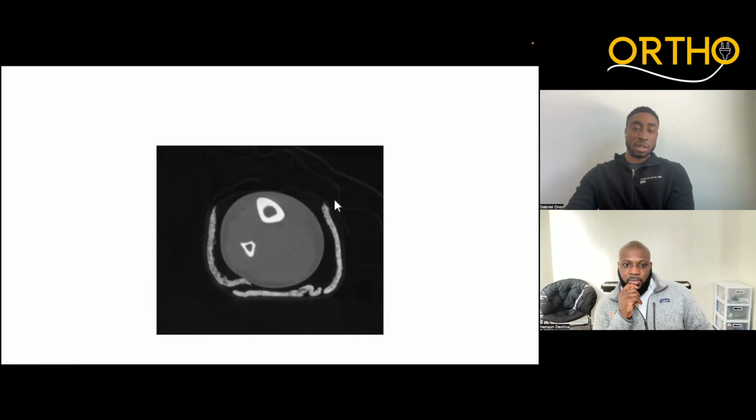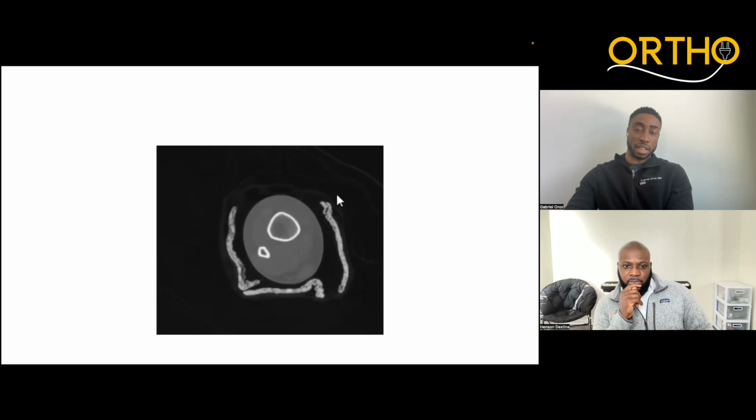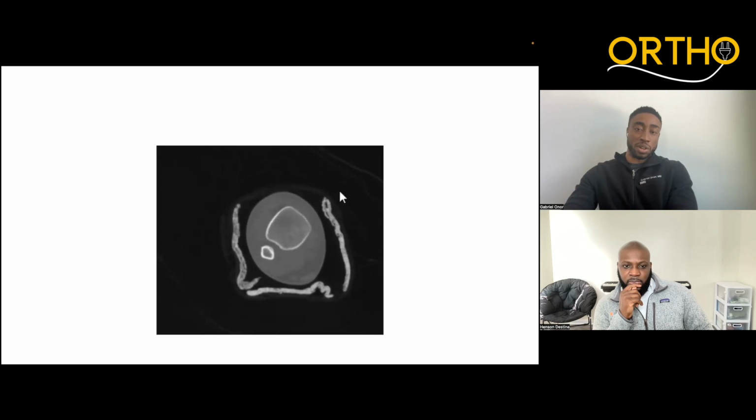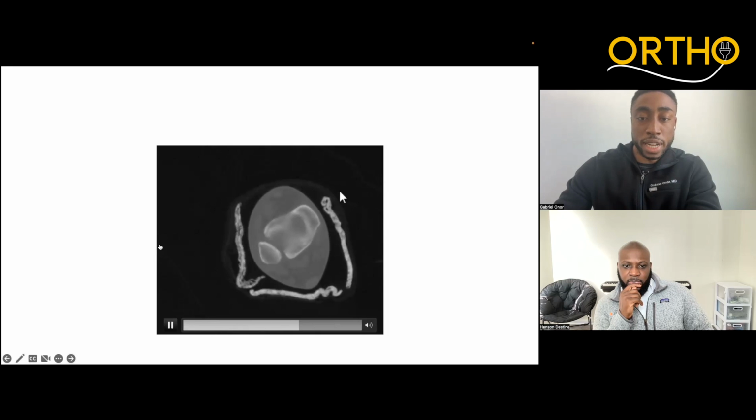So you can see this sometimes on the sagittal cuts of the CT ankle, but particularly I find it's often easiest to just look at the axial cuts in order to identify if there is indeed a posterior malleolus piece. So this is anterior up here, we've got lateral on this side. We know that because of the fibula being on this side, and this is posterior.